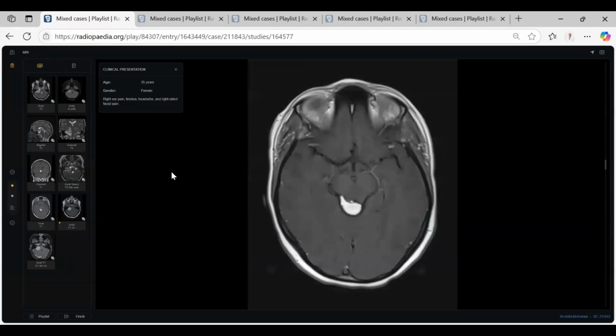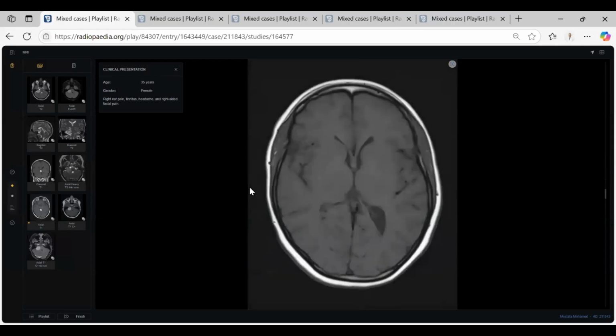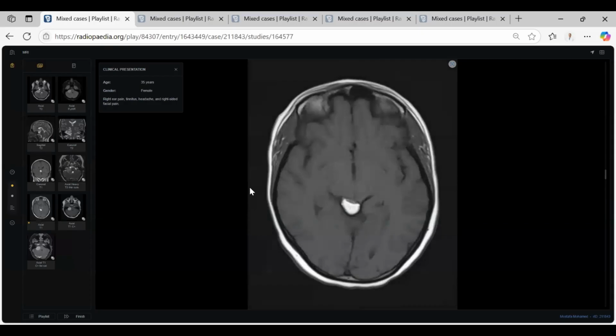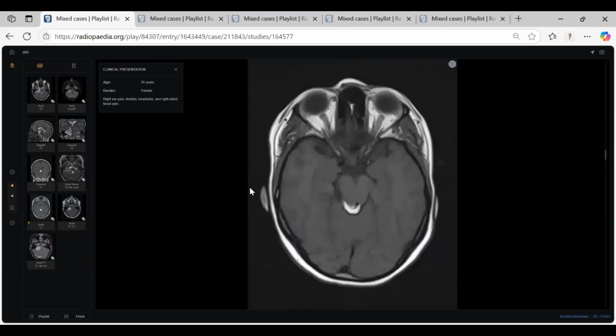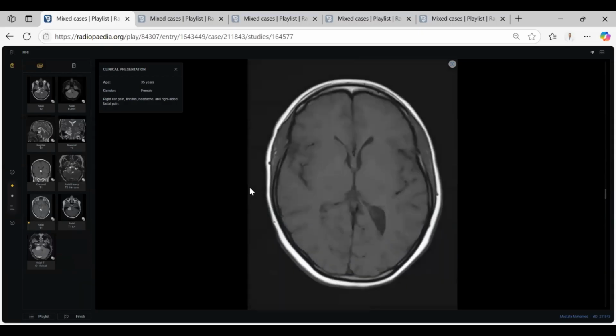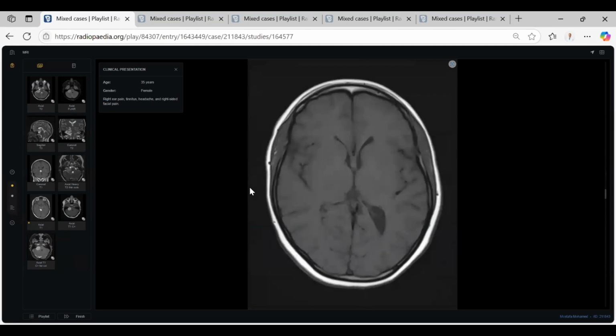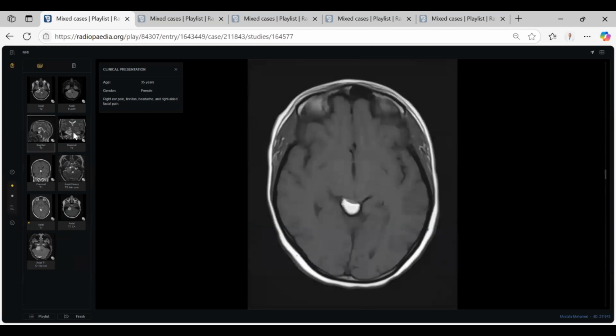Post-contrast. Okay. If I show you a T1 non-contrast, what is the difference? It is showing fat signal intensity. How could you confirm a diagnosis of lipoma? Which sequence? Fat suppression sequence, sir. Okay, like this, you are correct.